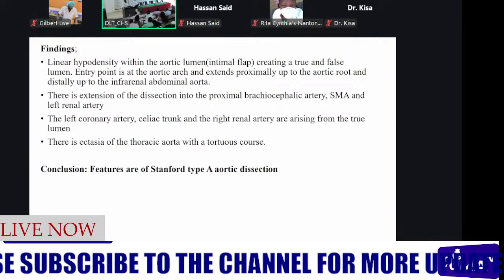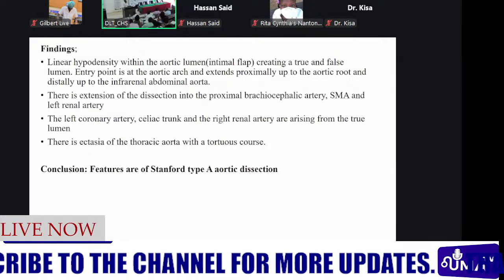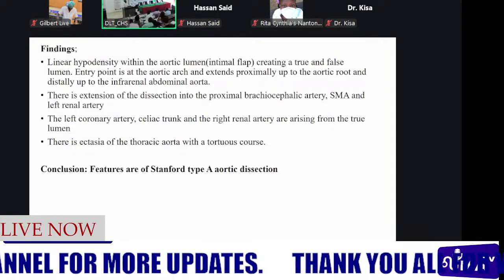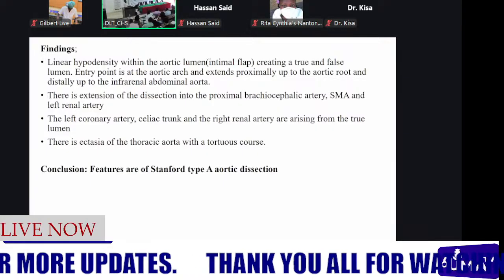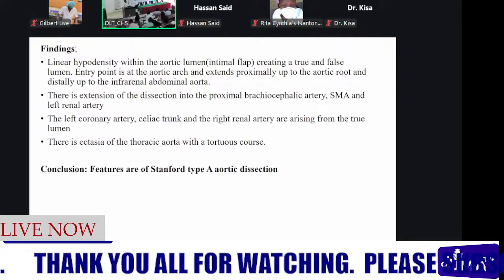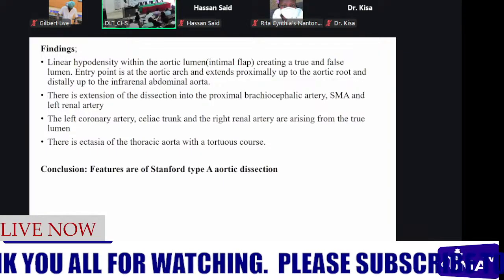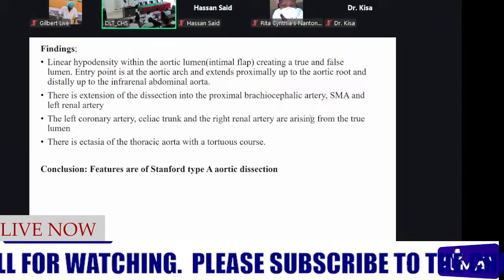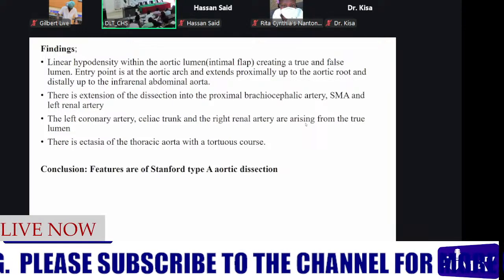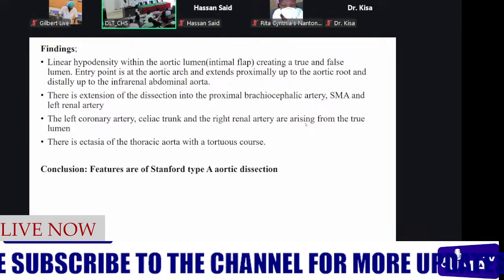Then there was generally ectasia of the thoracic aorta with a tortuous course. So in conclusion, the findings were of Stanford type A aortic dissection. That was it for the patient. The next images are for a comparative case that we shall also look at to compare with this. Maybe if we have any questions about the patient, we can first address that.